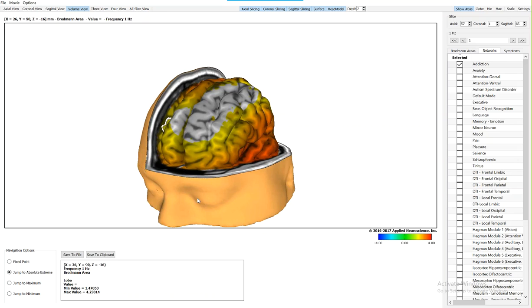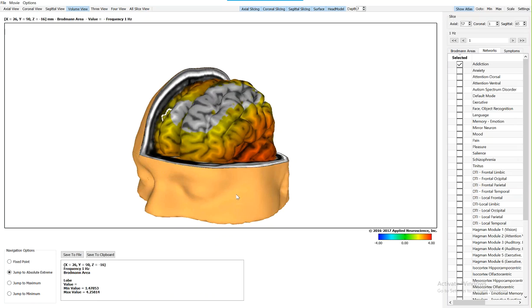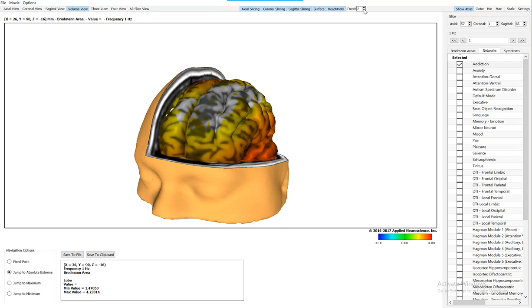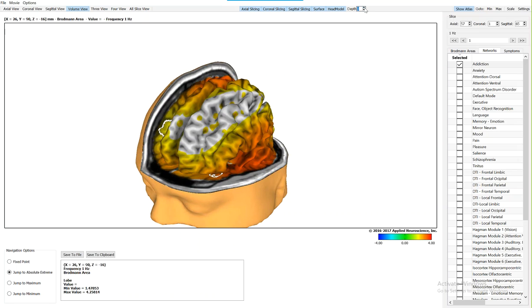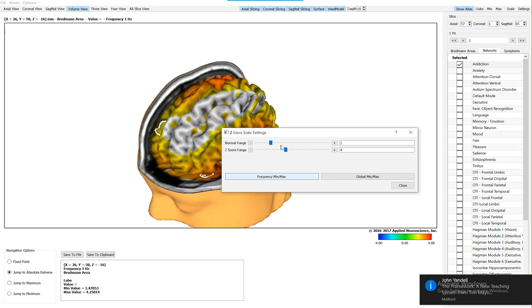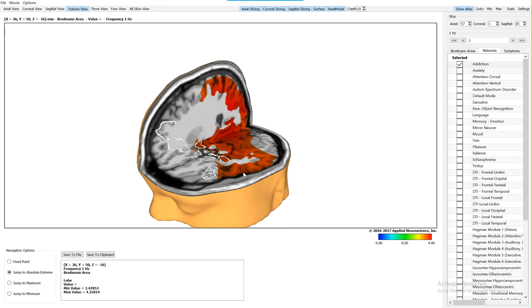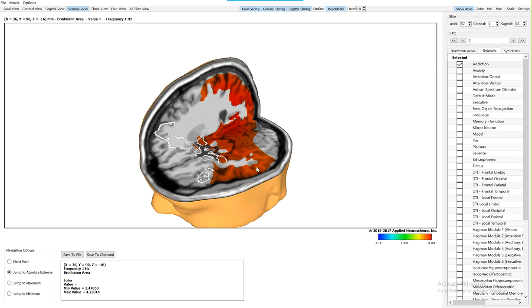Now here we put the volume back in and the surface of the view so you can evaluate the inverse solution. Now we're going down through the cortex and coming back up. That's one of the great things about swLORETA. It's a weighted swLORETA that allows you to go from the top surface to the depth of the cortex. Here we're going to move the scale for z-scores. Right now it's just at 1 hertz, but so that the z-scores there are at 2 standard deviations, and you can see which parts of the brain are deviant from normal.